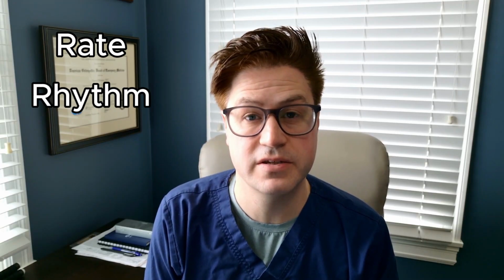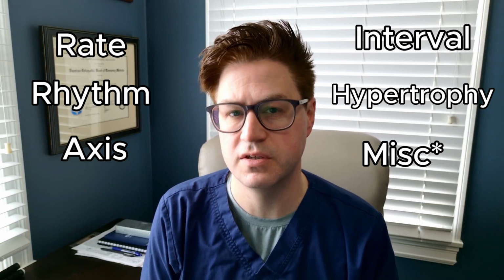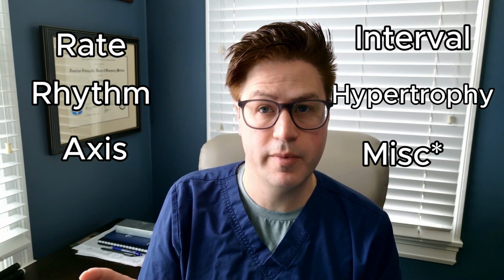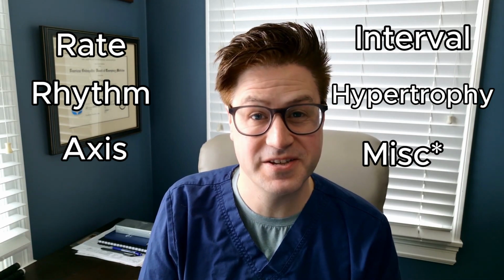So the system that I've set up is rate, rhythm, axis, interval, hypertrophy, and then any miscellaneous information, things that didn't really fit into the fundamental points I listed earlier. We can do a whole separate video sometime about miscellaneous things to look for, but right now we're just going to focus on the rate, rhythm, axis, interval, and hypertrophy. There'll be a practice EKG that I'll flash up at the beginning that you can try to interpret, and then we'll go over what the answers are at the end.